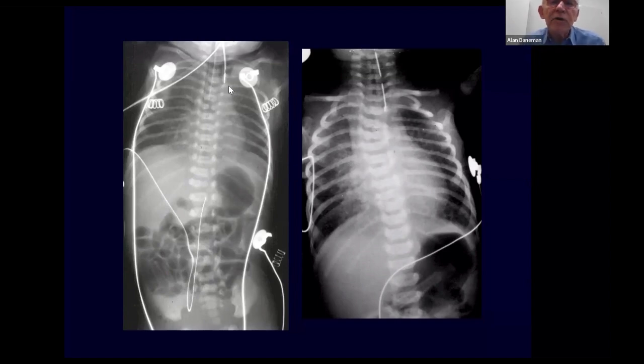Also, when you see this possibility of esophageal atresia or tracheoesophageal fistula, you want to look for other associated anomalies. You can see here a butterfly vertebra in the spine, some fusion here of these pedicles over here, and this one has cardiac enlargement due to a VSD and fusion of ribs. So look for the VACTERL associations, and also look for complications of the esophageal atresia, which is aspiration, and as you can see, there's some atelectasis in the right upper and lower lobes here.